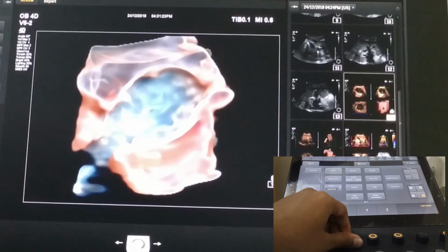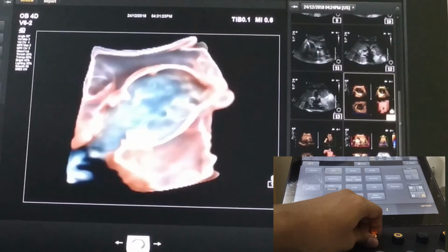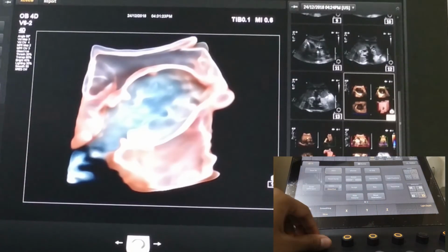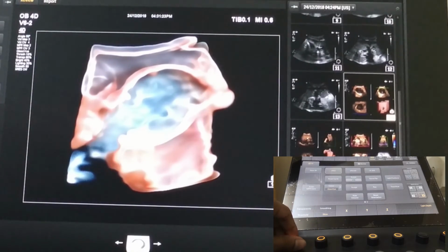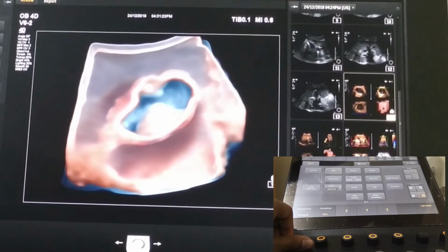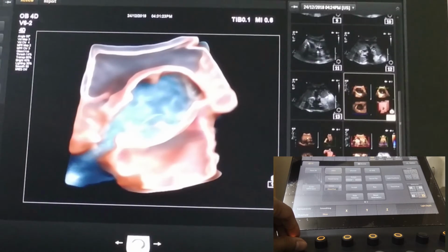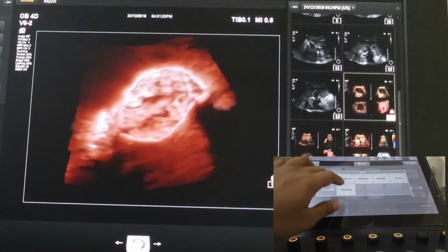I think I should rotate the gallbladder to see more of this view. Changing slice and threshold a little. Now you can easily see the luminal sludge which was difficult to see earlier. Checking it on TrueView again.